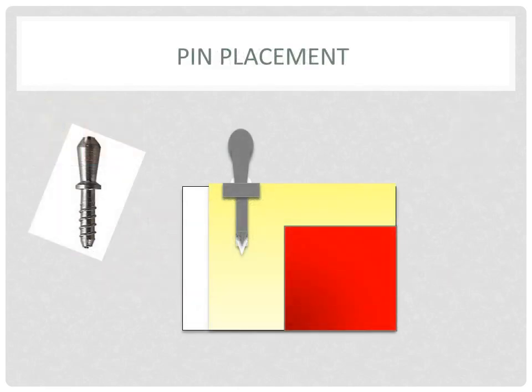The collar helps to distribute stresses across the dentin. Less stress is created by having the pin shorter than the channel. In most other pin systems, the channel and pin are the same length.